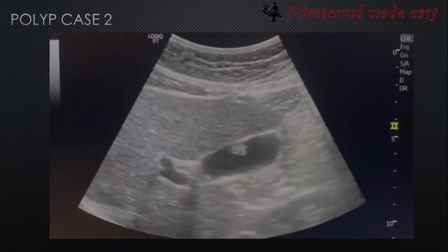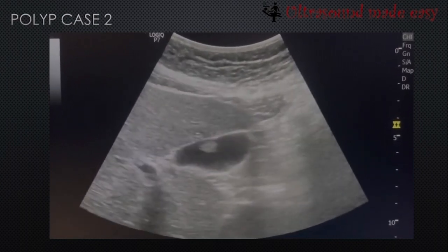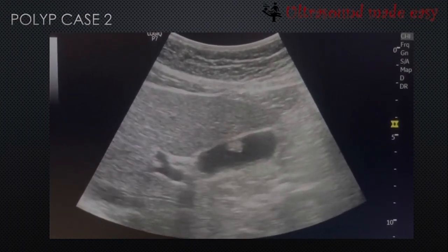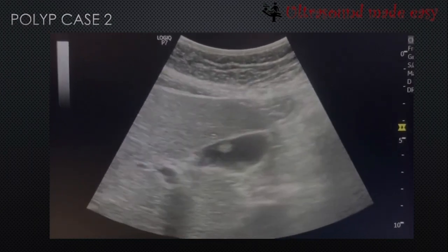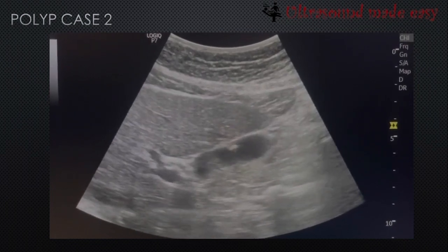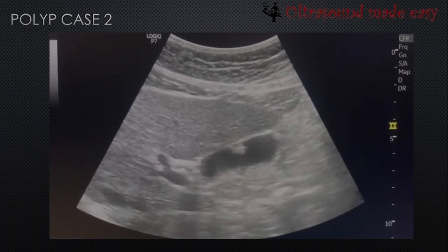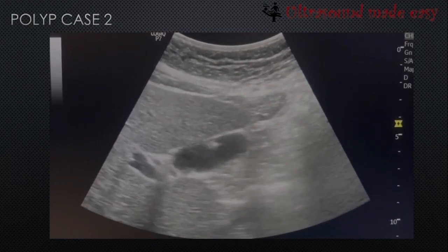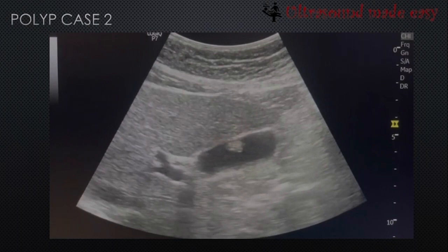This is another case, polyp case second. These are fixed masses attached to the wall of the gallbladder without giving any acoustic shadow. The acoustic shadow is not there, and we have to look for the feeding vessel. These are more likely polyps rather than a calculus. So these are fixed masses, echogenic content present in the gallbladder that is not moving, and without acoustic shadowing, more likely a case of polyp.